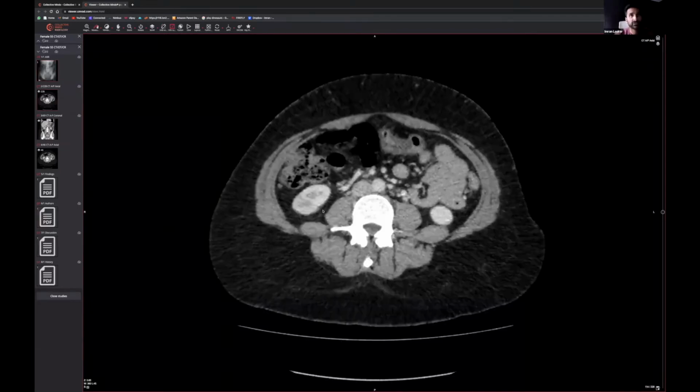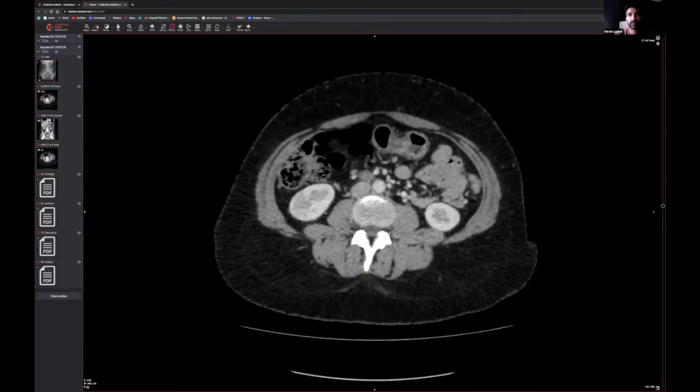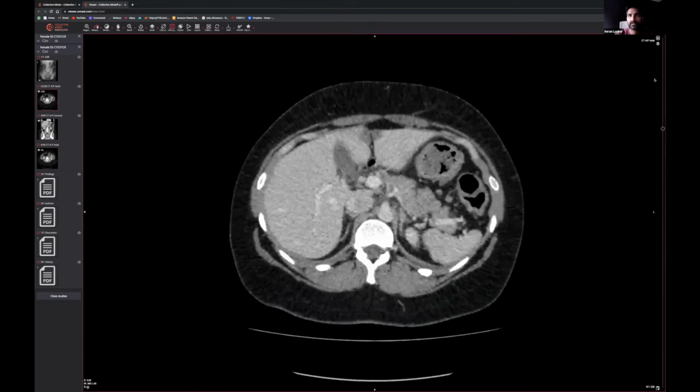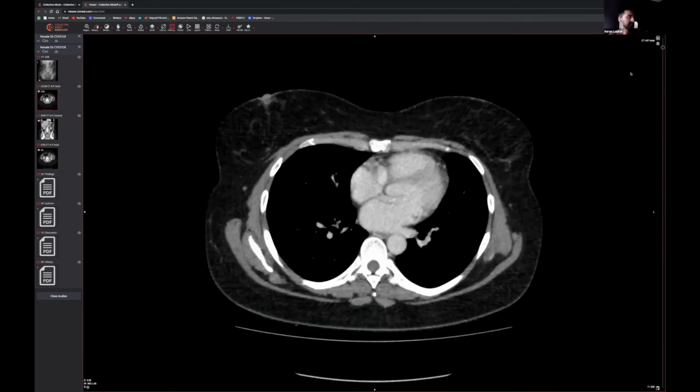So this patient's come in with abdominal pain and we've done the CT scan. Why would someone with abdominal pain, who's had that x-ray and has always looked like that, get a CT scan? It's because when someone has inflammatory bowel disease, they're predisposed to certain things. One of them is toxic megacolon, which acts like a bit of an obstruction. Exactly, well done.